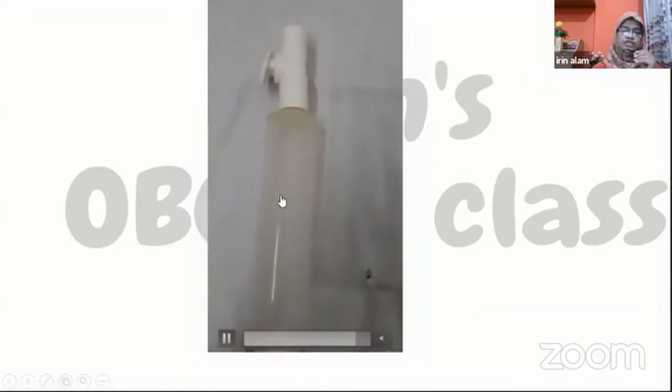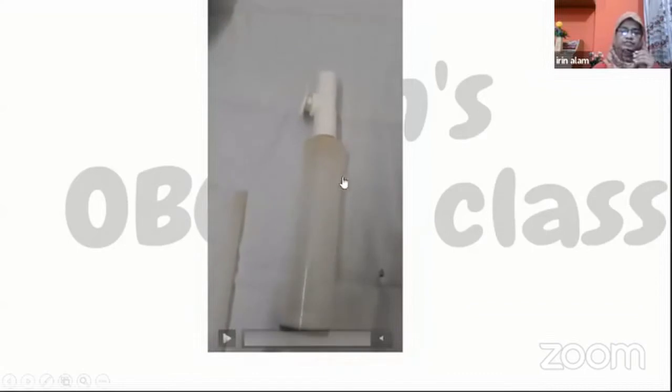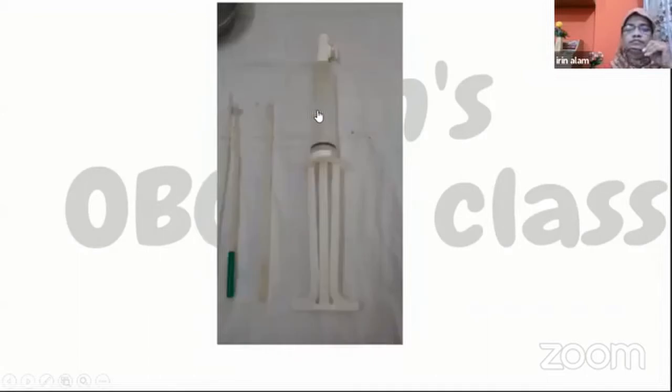It is used during MR, that is menstrual regulation. During menstrual regulation, a cannula is attached here, and it is introduced into the cervix, and the content is evacuated by creating negative pressure within it. These are the cannulas. So this is used during menstrual regulation. These are the MR cannulas. This is green, and this is the MR syringe.